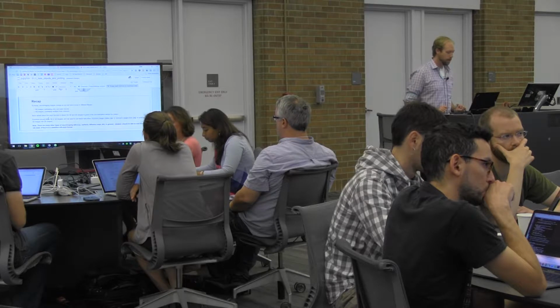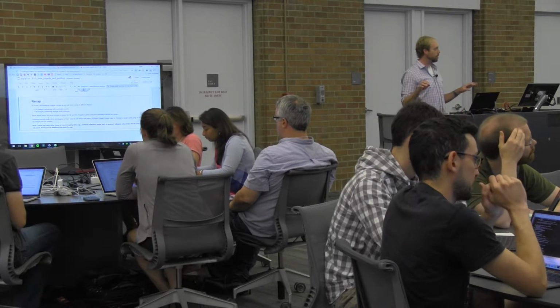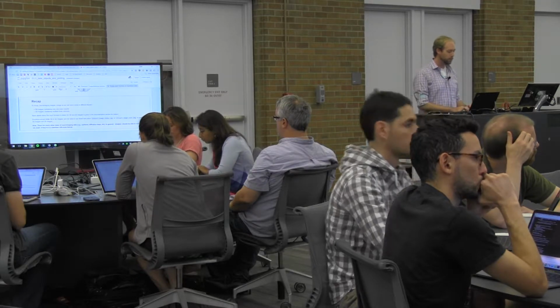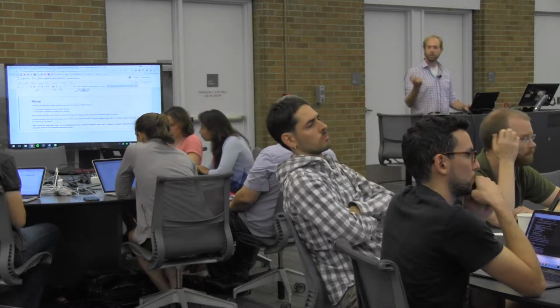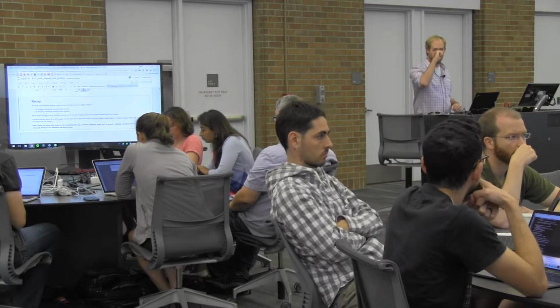Okay. So that was very, very quick NiBabel 101, maybe a bit of nilearn and visualization 101. This is really just scratching the surface of the API that is available to you here. And what, yeah?